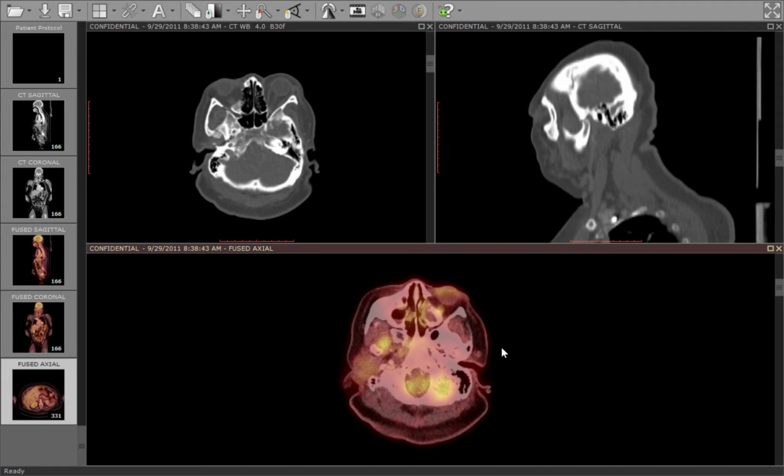So again, this case, this PET CT was ordered for cancer. It was not ordered for this purpose at all. This was a completely incidental finding, but I just thought it was interesting that this patient had a subluxation of the right condyle and increased fluorodeoxyglucose uptake in the right lateral pterygoid muscle, probably reflecting either spasm or overactivity that is leading to the subluxation.